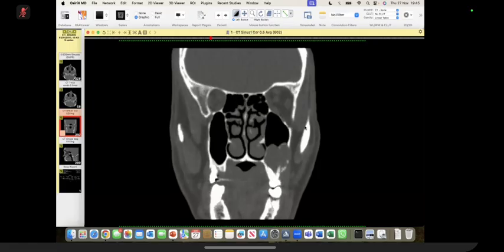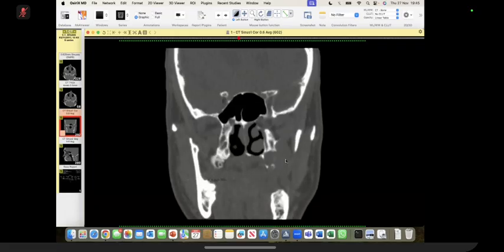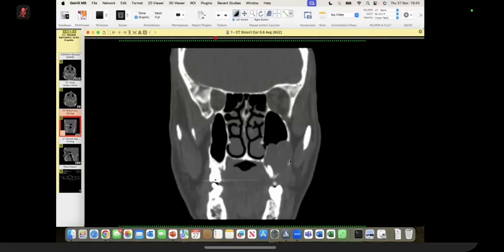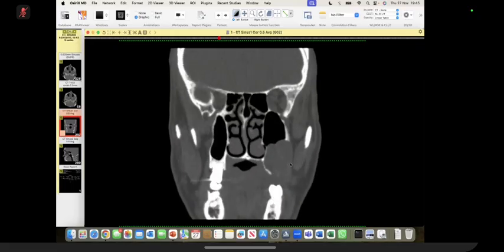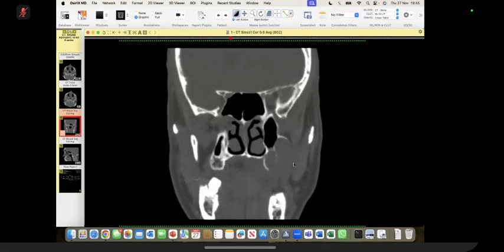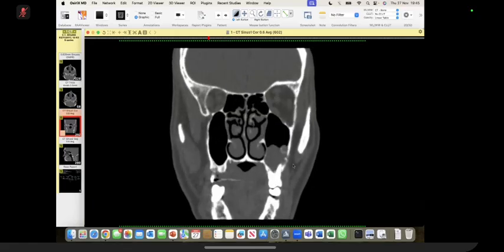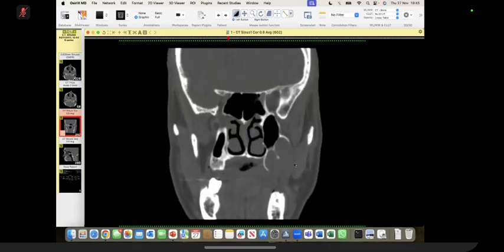Now, as far as this is concerned, you can see the same thing, and this is the concept of bony expansion. It's not destruction as in metastasis or squamous cell carcinoma. They will not give any time for expansion. They will just destroy it. So ameloblastoma, by definition, is a locally aggressive benign lesion. Please remember, 2, 3, or 4% can convert to a malignant version also, but that is rare.